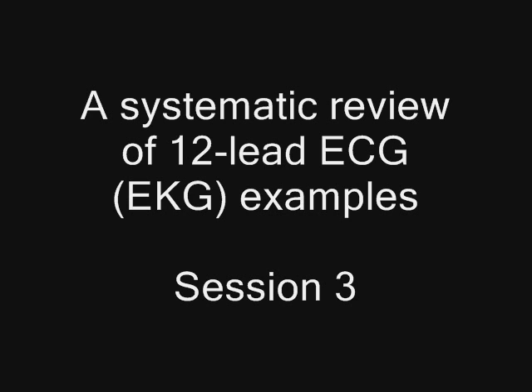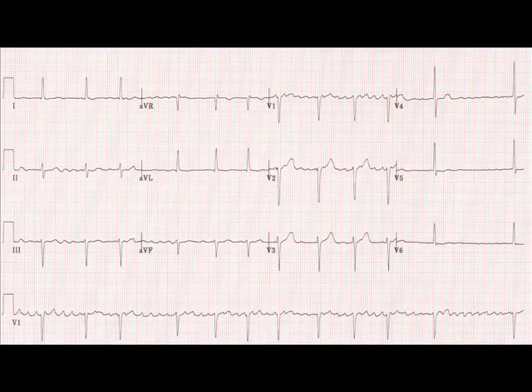And as promised, I'm going to talk you through a series of 12-lead ECGs or EKGs utilising the systematic approach. And then afterwards, I've left a series of examples for you online that you can practice independently utilising the systematic approach, and you can have a look at my answers and information there as well. But let's stick together for the moment. And here's the first example.